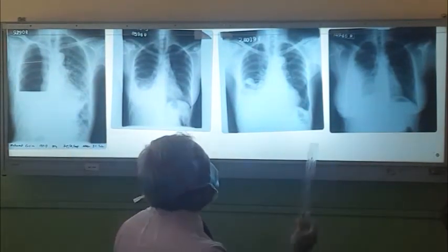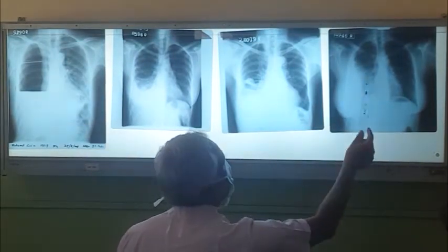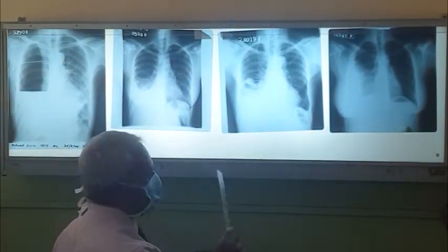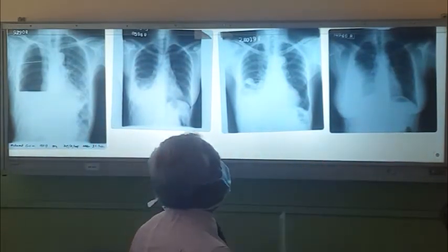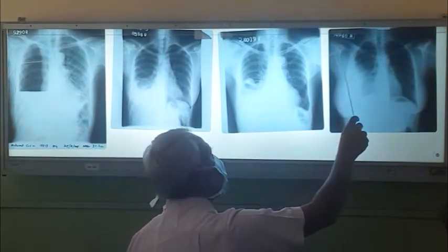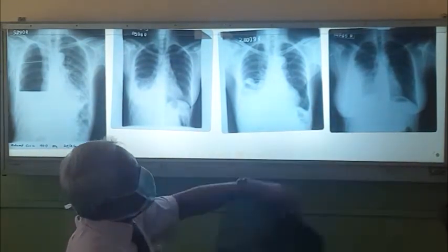Then, so this patient has a homogeneous opacity which is laterally placed, and in addition to that some opacity is there. So this is a laterally encysted pleural effusion. The pleural effusion is going around and it is encysted there, right? And you can see the diaphragm also here. Otherwise, a simple pleural effusion will look something like this, with a concavity line moving up, right? So it's a lateral encysted pleural effusion.